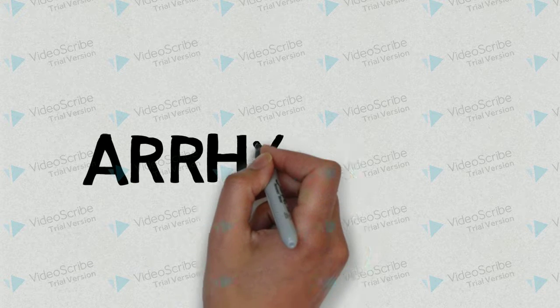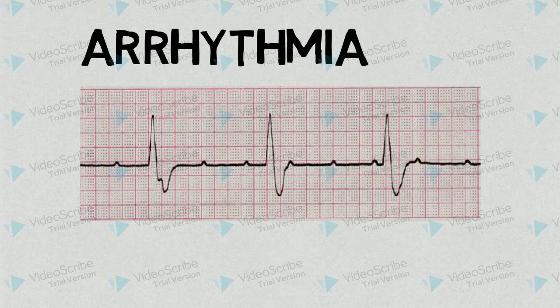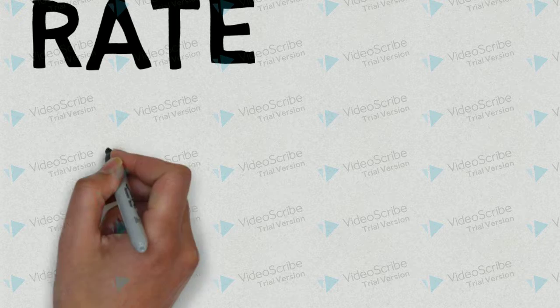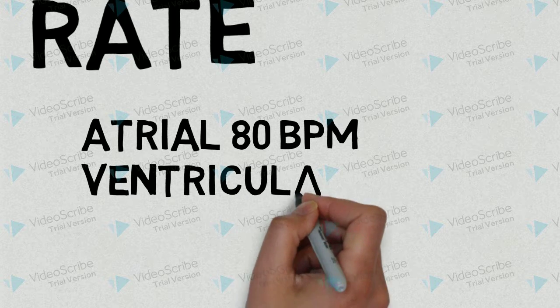So today we're going to talk about an arrhythmia, and we'll take a look at our 2-lead strip. In order to figure out what this is, we're going to use our 5-step method. Taking a look at our rate, we know that we have an atrial rate of approximately 80 beats per minute, while we have a ventricular rate of 30 beats per minute.